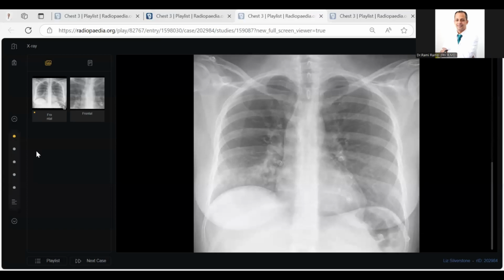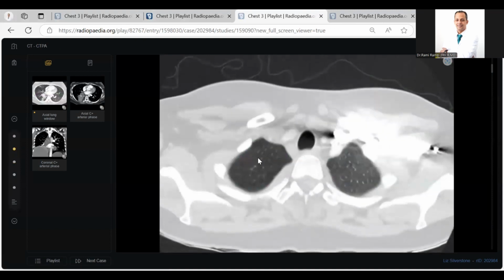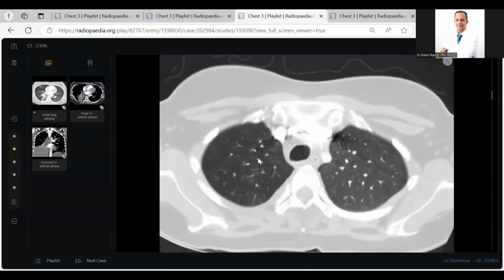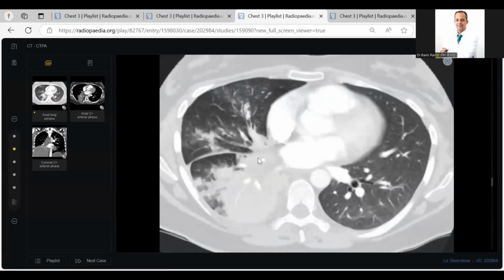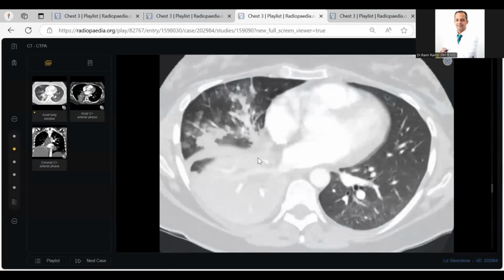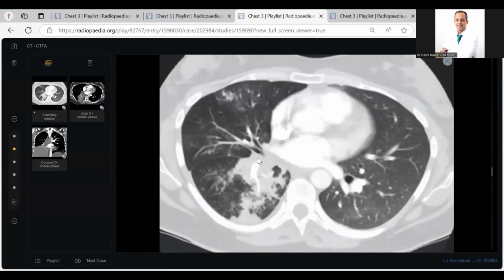The patient is in your department. What will you do in your department? I would proceed with a contrast CT chest of this patient. I'm provided with axial contrast CT chest, lung window images. In this patient, this confirms the presence of consolidation in the lower lung. I would like to go through the entire stack of images before commenting further, from cranial to caudal end.